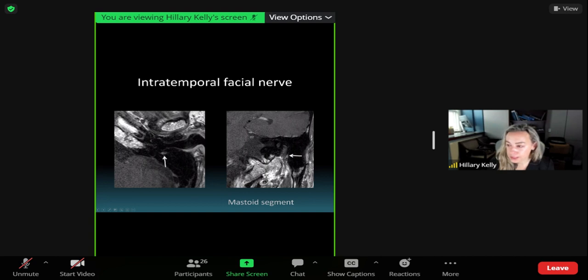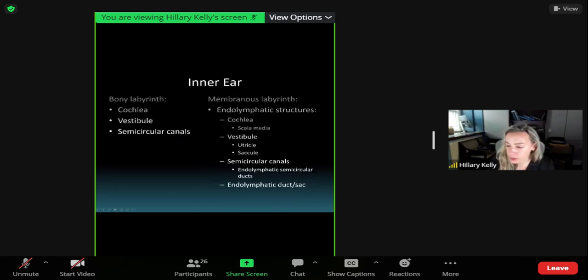This is a nice cone beam CT again, just showing the entire superior canal in parallel. So this is what's called the Poschl view. And then the Stenvers view is down the barrel of the superior semicircular canal. We use these when a patient is coming in and they're questioning superior semicircular canal dehiscence, which is another entity that can result in conductive hearing loss.